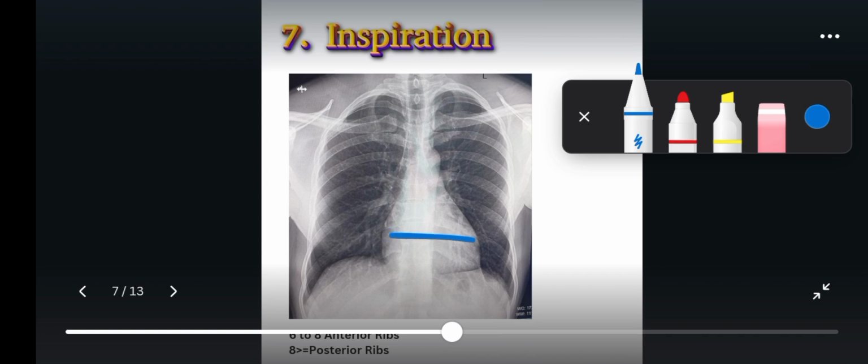We measure this and take the ratio of the two to assess the relative size of the heart to determine whether the patient has a feature of hypertensive heart disease. But if the radiograph was obtained under the condition of poor inspiration, the lung cavity will not expand well, so it will appear closer to the heart, and every structure inside here will appear crowded, so the ratio will not be correct.